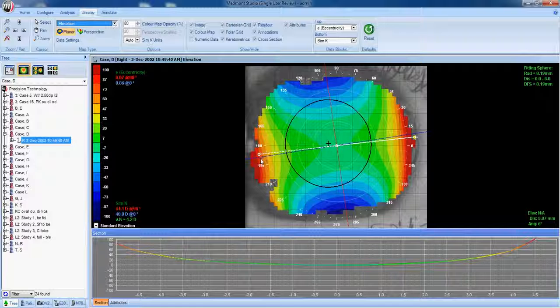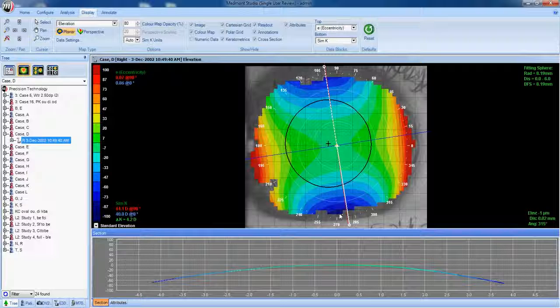This is where our rigid lens would bear most. On the vertical meridian, we see the colder colors, meaning the cornea is below the spherical surface. The cornea is effectively depressed against the spherical surface. So we have a point of lift of the lens at 12 and 6 o'clock. If we put a spherical GP on this eye, we would have points of bearing at 3 and 9 o'clock on this with-the-rule corneal astigmat.